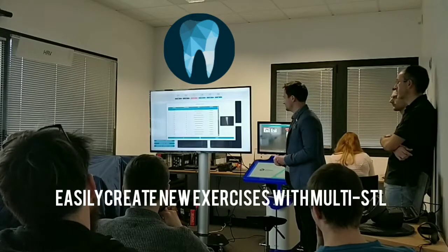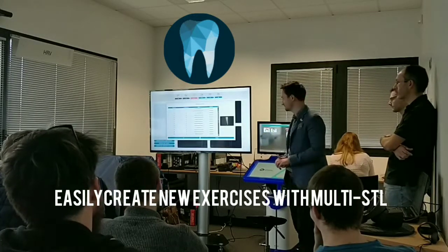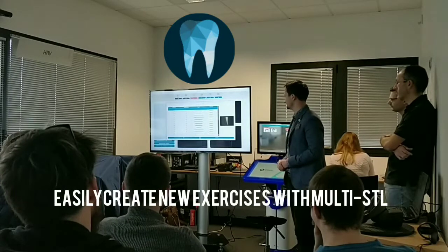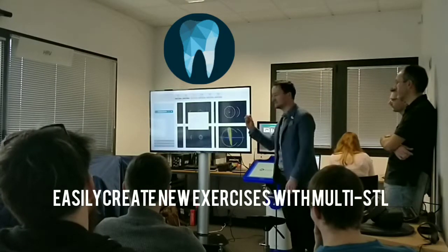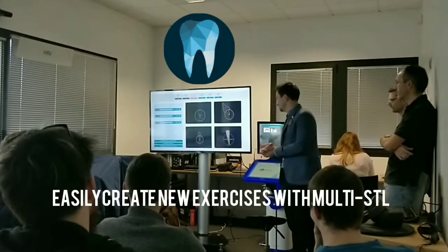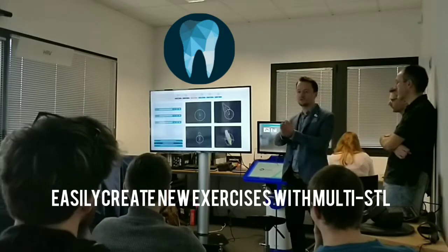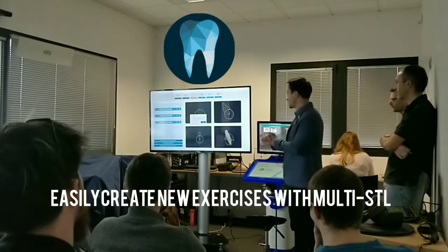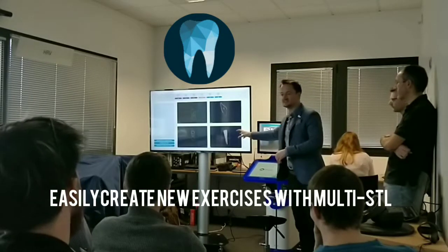In our solid creation, we have a whole library of teeth for an adult mouth. So we can import any of these. And you see that we create a tooth out of the dentine, enamel, and the pulp. And so this is unique to Virteasy, where we can actually handle multiple STLs at one time. We can control the density of each layer, and we can also use this for teaching students the anatomy of the teeth as well.